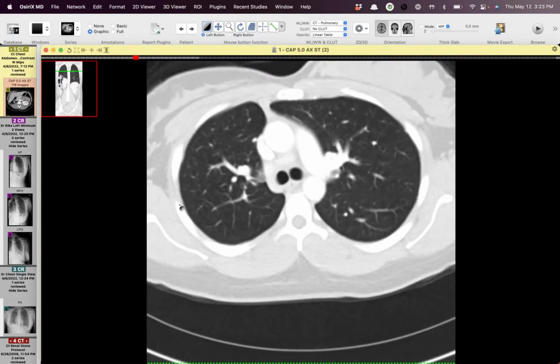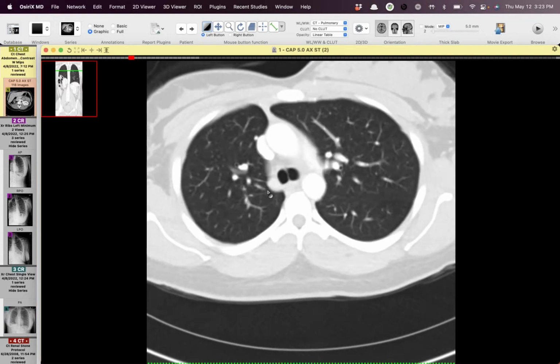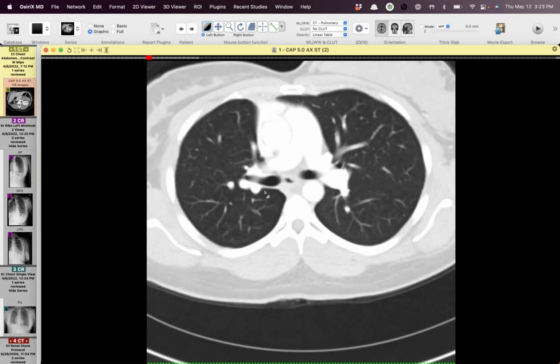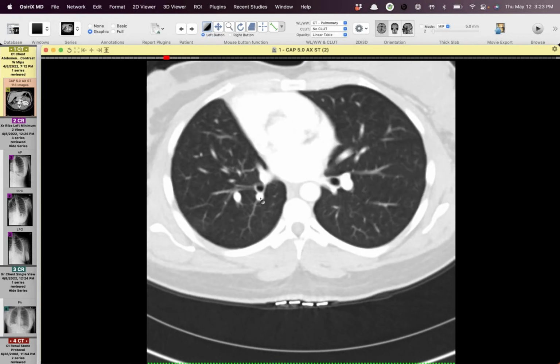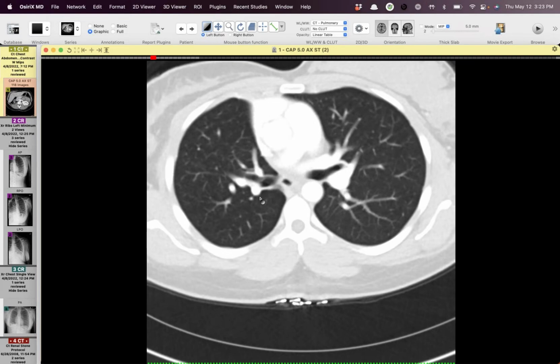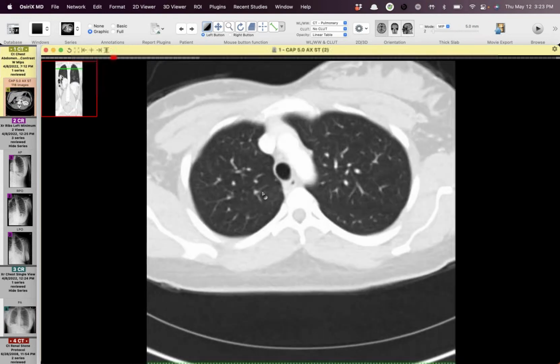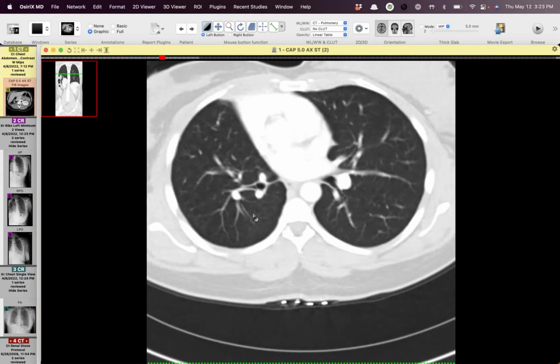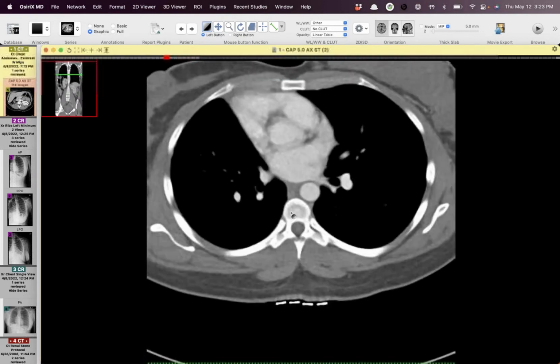The typical findings that we've discussed, it's been a while since we've shown a lot of scimitar cases, but you've got a rudimentary right lung here with a right upper lobe bronchus, and then not really a bronchus intermedius, and just a few basilar segments. Or maybe you argue this is right middle lobe and right lower lobe, and there's no right upper lobe, but definitely abnormal airway anatomy and no real fissure here. And I only saw one pulmonary vein on the right there.